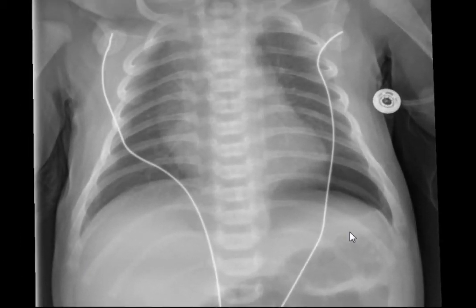Sometimes a pneumothorax can be confined to the subpulmonic area only. This is air under the lung, pushing the base of the lung superiorly. If you'll notice, the rest of the lungs have a very symmetrical appearance. And just a word of warning, if you happen to do a right lateral decubitus view in this patient, the air may not necessarily go out over the edge of the lung, but that does not mean it's not a pneumothorax.